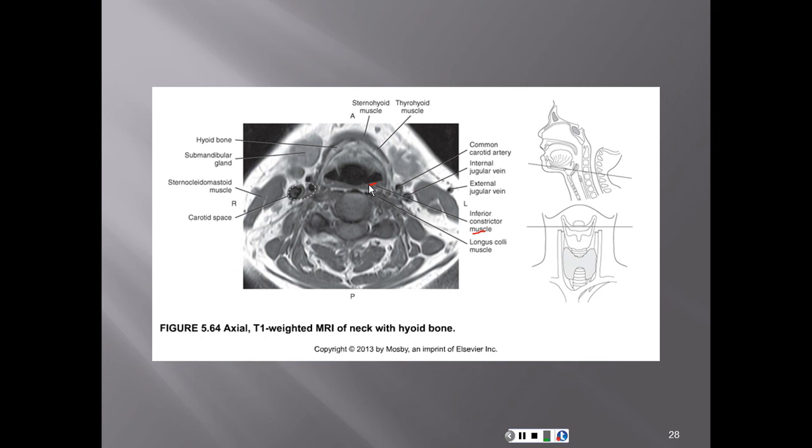So we're a slice lower than where the palatopharyngeus muscle would be. And the largest constrictor is the inferior constrictor muscle. It's innervated by the vagus nerve, and when food is swallowed, the constrictor is what moves the food down the esophagus.